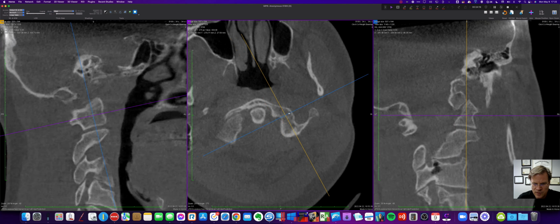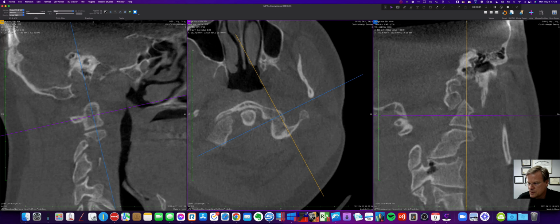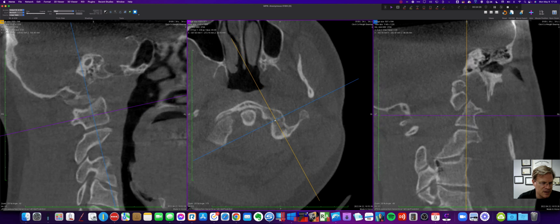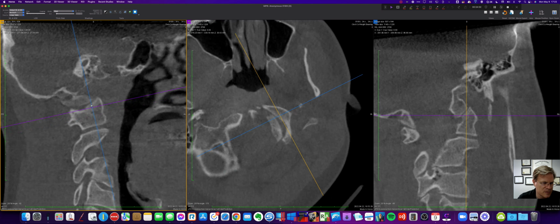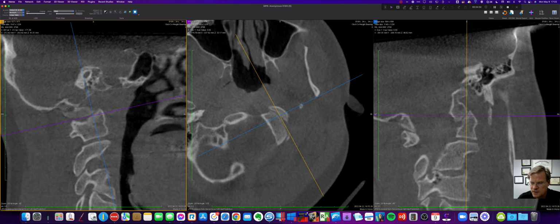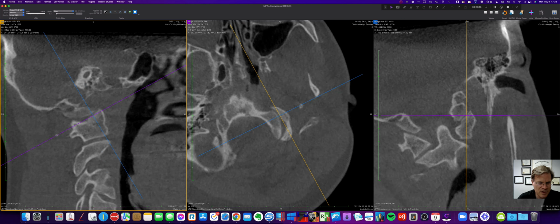Okay, now we're going to come out here to the edge. Oh, that really looks like one, but maybe we're too far forward. At this point, we don't know. Oops, and now I can't see my convexity angles. So let's bring it here. Let's come up. And that's looking pretty much like an ASR. That's more an ASR than an ASL was on the other side.